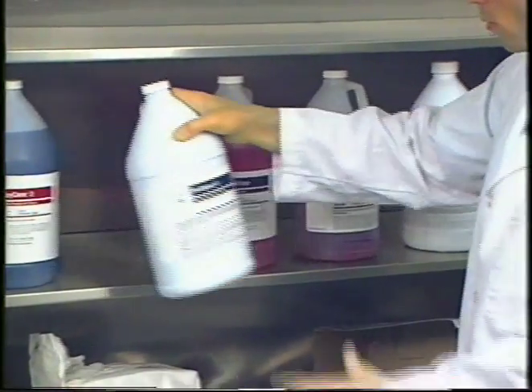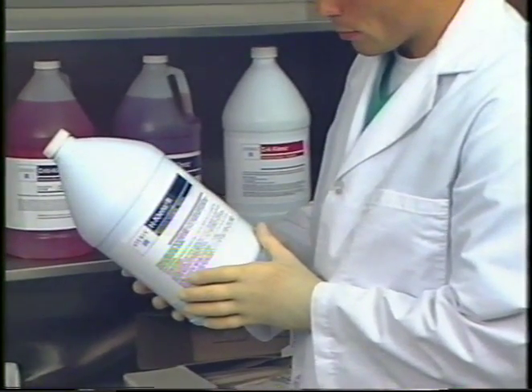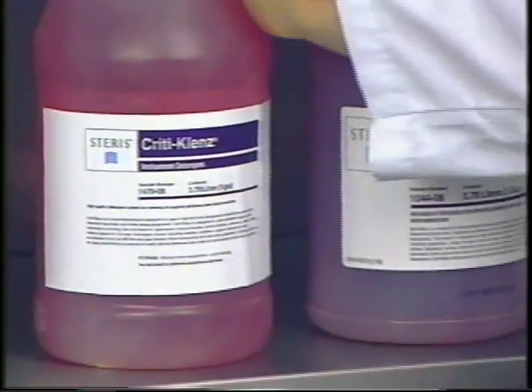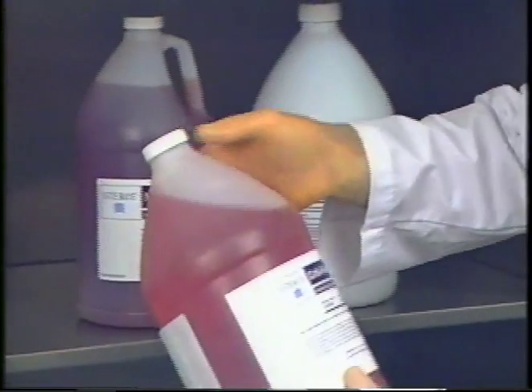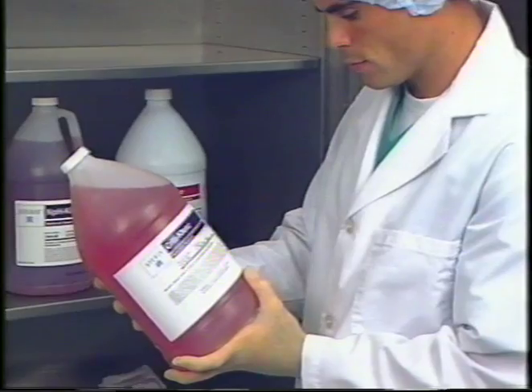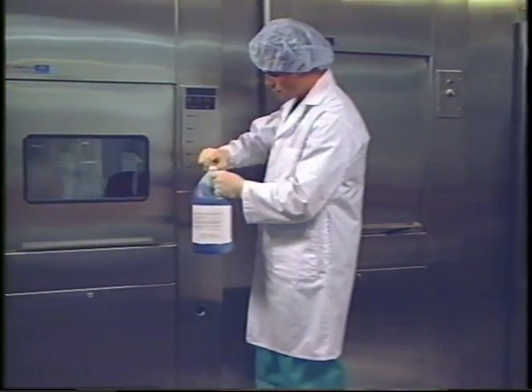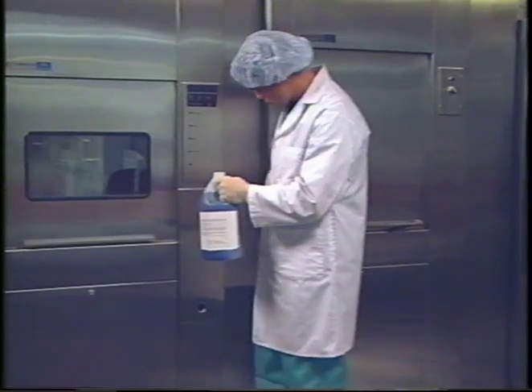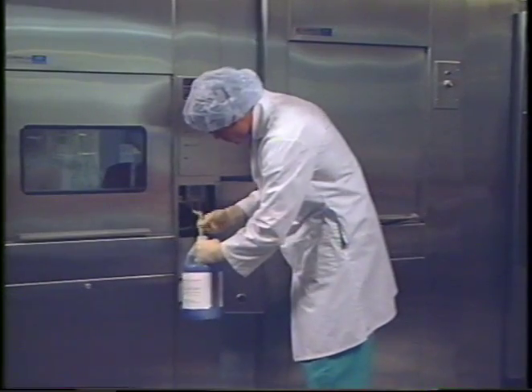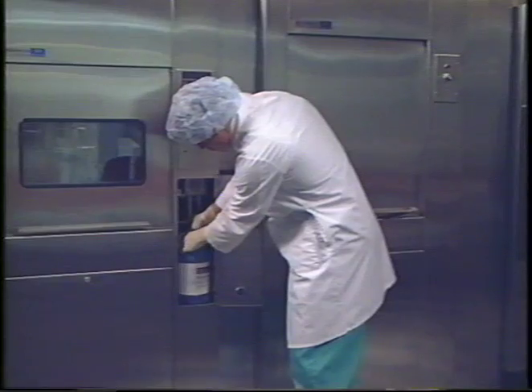Sounds easy, doesn't it? But really, it's a complex process by which the appropriately selected detergent compound, by virtue of its chemical and physical properties, lowers the surface tension of the water, allowing for better contact of the water with the device being washed. This union assists with the solubilization of albuminous soil, increases the emulsification of oils, and suspends the soil particulate in the solution where it can be taken away.